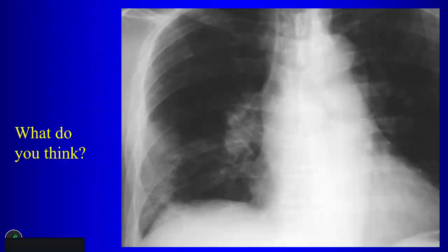There are actually two signs on this chest radiograph that you can talk about. Like peripheral opacity. Yeah, so the peripheral opacity, right? What might that represent? It's like Hampton zone. So it's an indication of what? What would this represent then? Yeah, so Hampton's hump, right? So that might be an infarct, okay, especially if the patient's presenting with signs of pulmonary embolism.